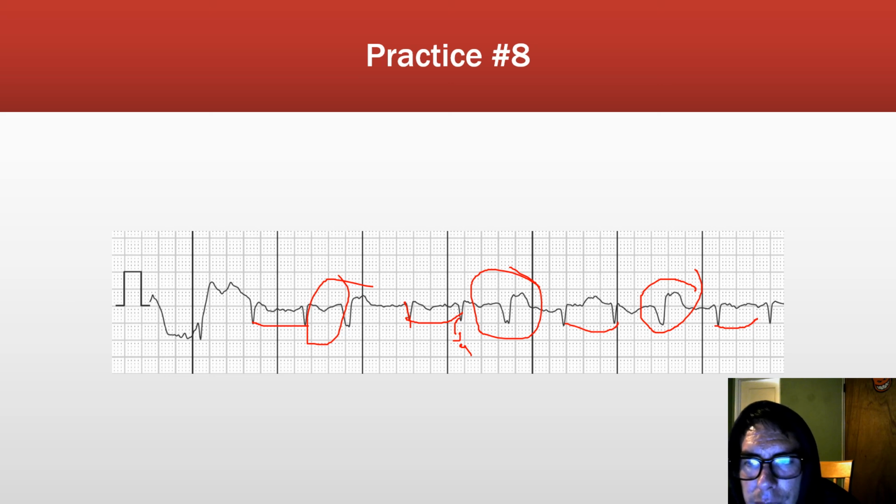So this could either be AFib, and those aren't P waves I'm seeing, or this could possibly be something called a wandering atrial pacemaker with ectopic premature ventricular complexes. Don't worry about all that right now, but those are the steps, like what we're working on right now, the whole reason.